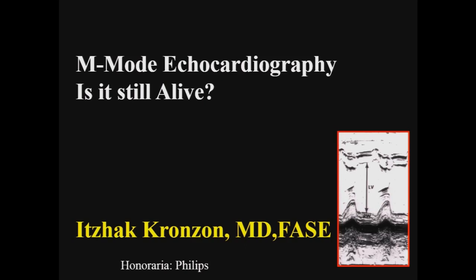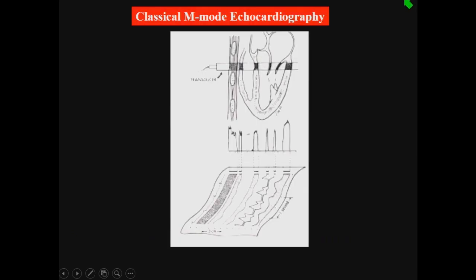So right now, look at the images. M-mode echocardiography has practically only one dimension. And it's true that you see a two-dimensional picture, but one dimension is what we measure, and the dimension that we measure is depth. The other dimension of the picture is simply the speed of the paper or the speed of the screen, and therefore the other dimension is time. So what we have is depth against time.